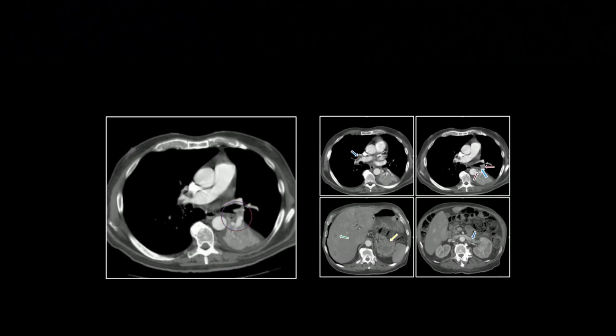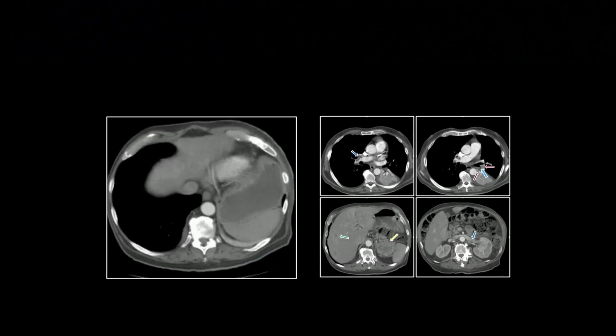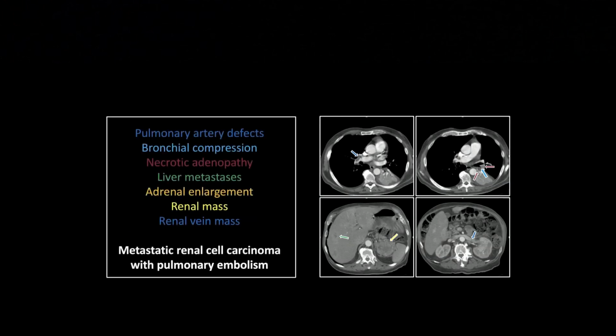All right, so that is an angioinvasive renal cell carcinoma presenting with pulmonary embolism. You know, the involvement of the adjacent, that's probably direct growth into the adrenal gland. And the involvement of the adjacent adrenal gland is very common. That's why, in fact, they used to call these the hypernephroma. That's the old name for renal cell.